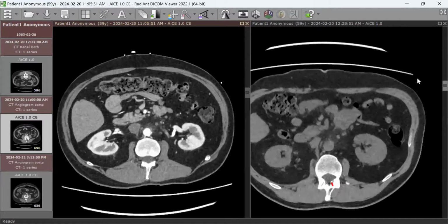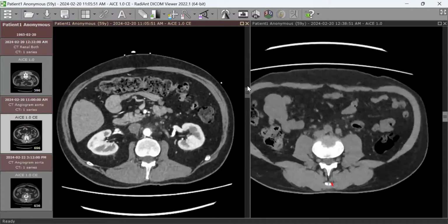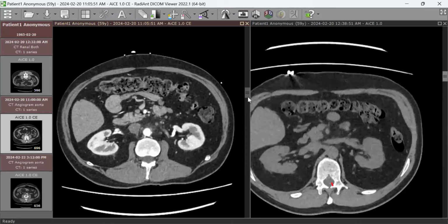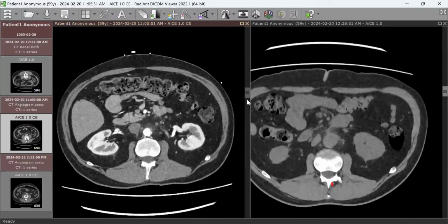No obvious significant atherosclerotic process, just small foci of calcification, which isn't significant for the age of the patient. It's okay.